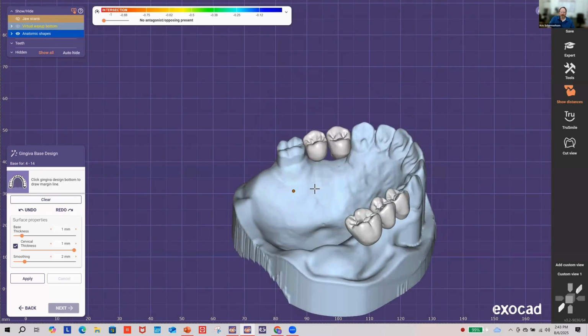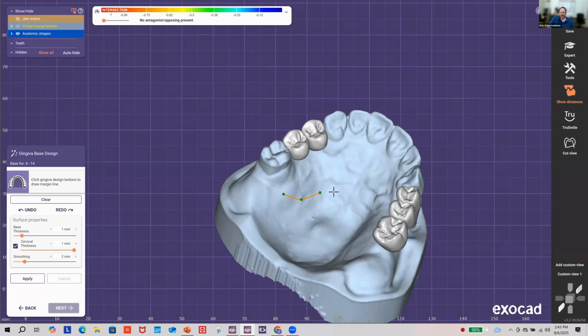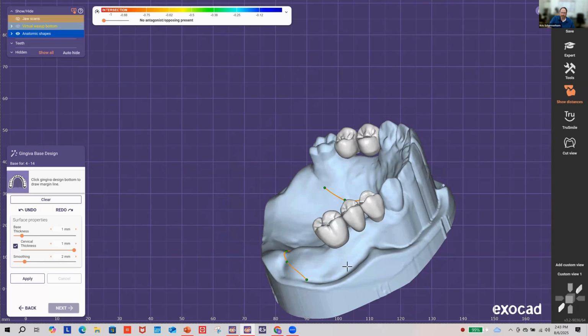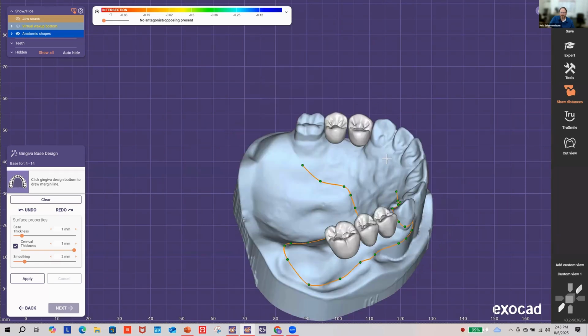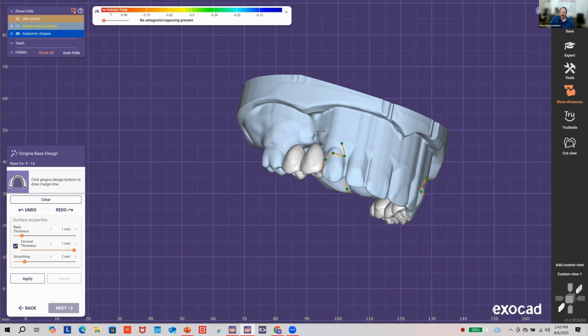And so now you just are going to create your bottom. I'm going to do something a little different than the scribe line shows back here, just so I can demonstrate something. But I'll go ahead and follow that. You can be real precise in doing your spline, creating this, or you can go real fast like I am and then go back after and correct. And so that's what I tend to do. I'm going to go across and do kind of an apron here or a strap. And again, I'm kind of going quick.